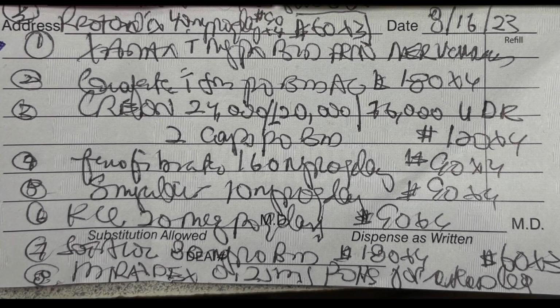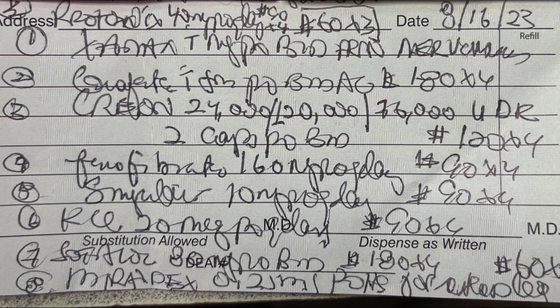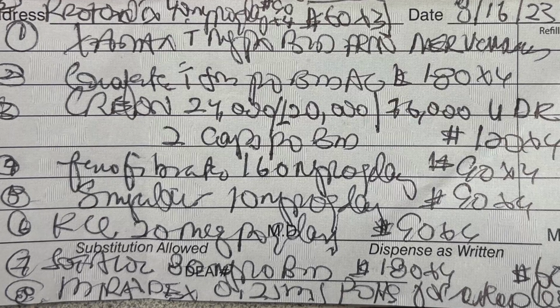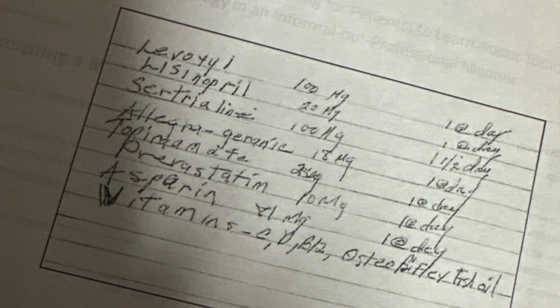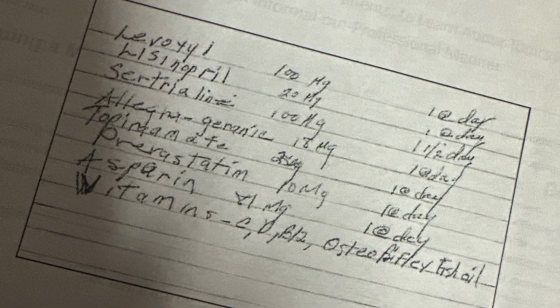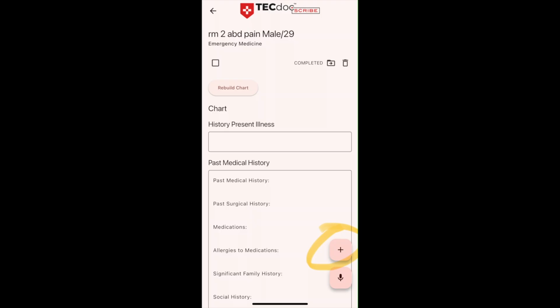Another great feature of the app is the ability to add photos and to take photos. So for example, one of the things I use this for is that med list that the patient comes in. You can actually take a picture of this and the scribe will work to transcribe it and list it in the narrative of your note. So it doesn't put a picture in the chart, it instead transcribes the data it's seeing.